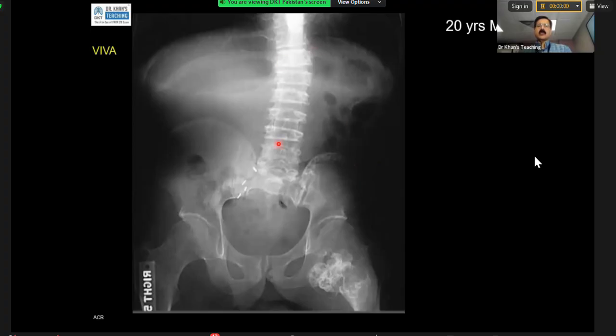If you stretch your imagination, what is happening? This patient had Wilms tumor. This tells you surgical clips, so there must be some lymph nodes which they have removed. The tumor was on this side. This is the radiation portal. After surgery, they also gave radiation because there were lymph nodes. Because of that, there is atrophy of this, and the adjacent side of the vertebra is disproportionately involved. So you can imagine that this was the radiation portal.